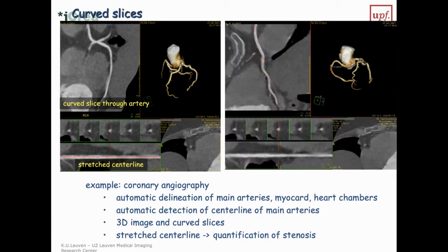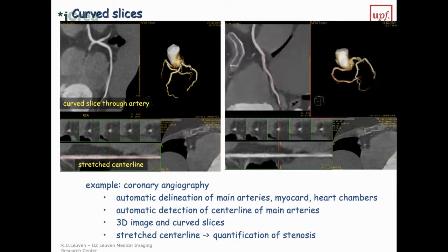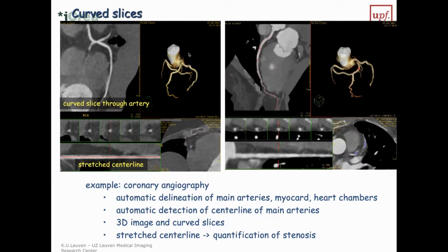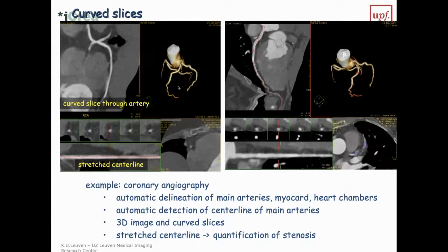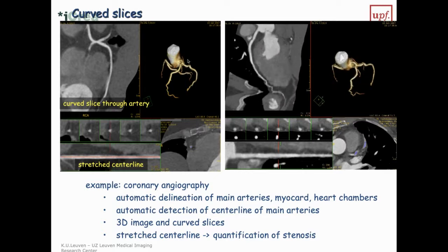One of the things that you see also is already the difference between the resolution. What you saw is that with coronary angiography, we can see all the smaller vessels and bifurcations. Here with CT, we can only see the larger vessels, only the proximal part. Now for disease, this is often enough. Of course, for treatment, that is something different.